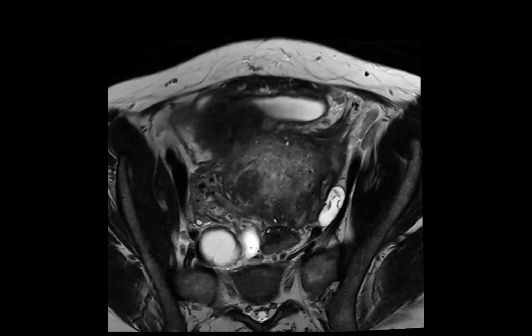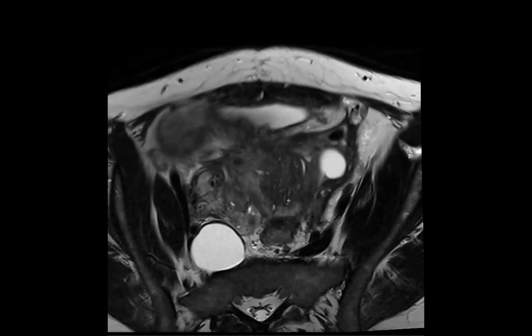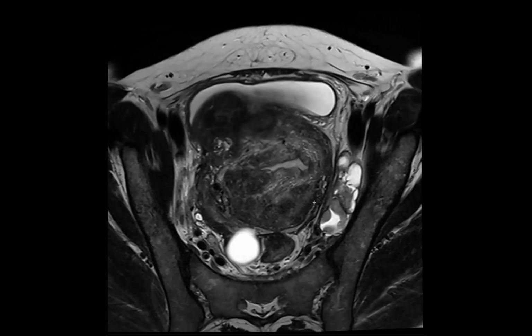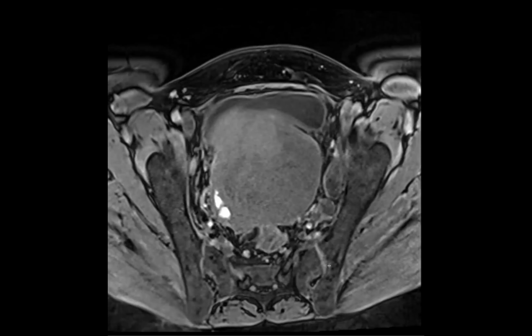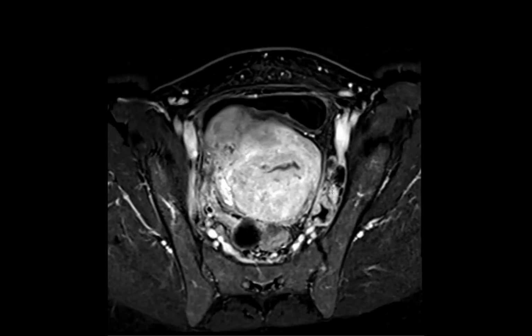And I'm showing this case, and there's adenomyosis. You can see these T2 cystic spaces here. But what do you guys think about this thing here? Yeah, there's like polypoid soft tissue there, right? We should look at the contrast. Here's your pre. Okay, there's like endometriotic deposits there, and then here is your subtraction. I would worry about that polypoid soft tissue there.